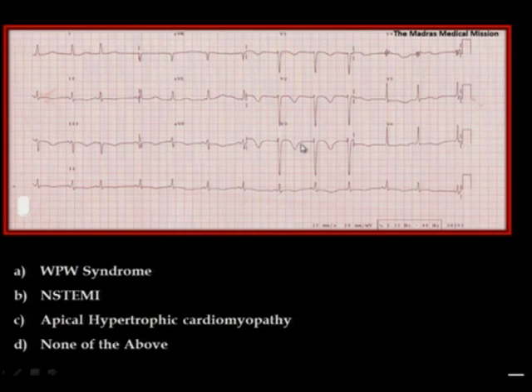having such QT prolongation. Look at this QT prolongation. It is more than 75% of the RR interval. And we know that the QT interval prolongation, which is a risk factor for ventricular arrhythmia, can have episodes of atrioventricular dissociation, appearing sometimes short PR. So this is not non-STEMI. This is some long QT types.